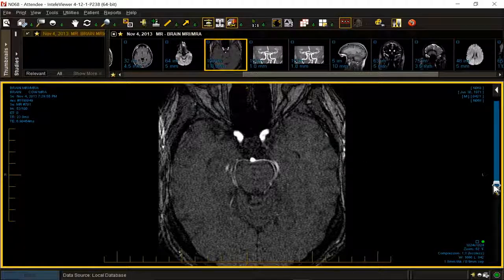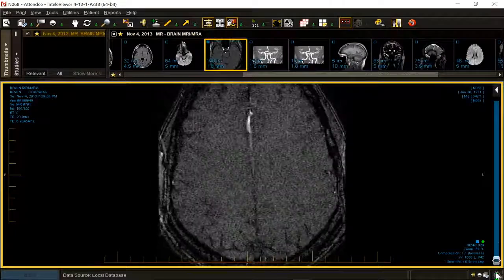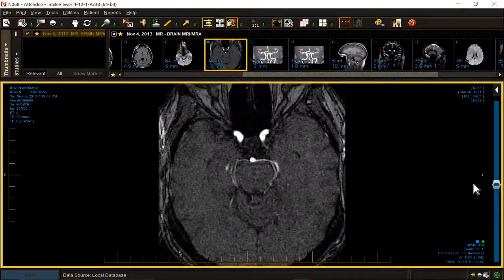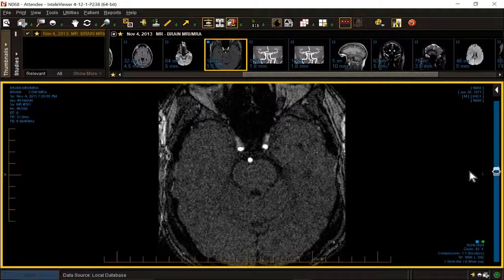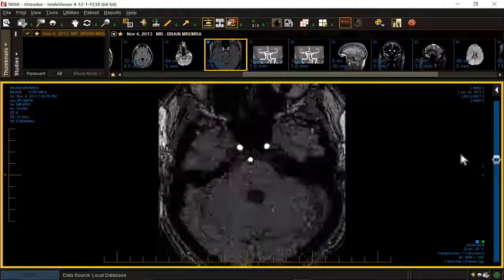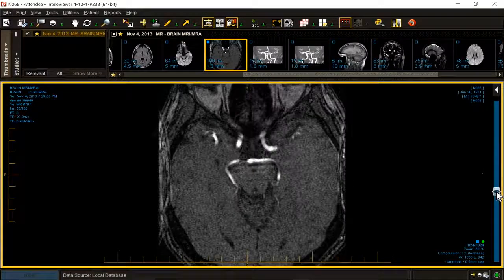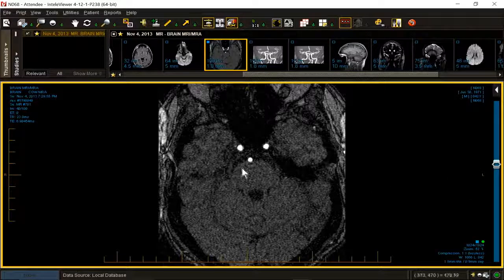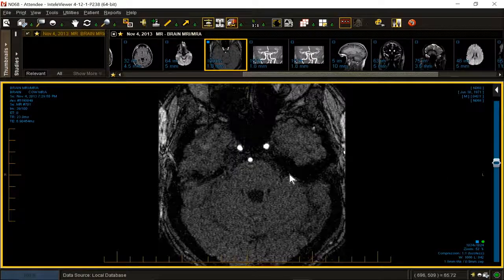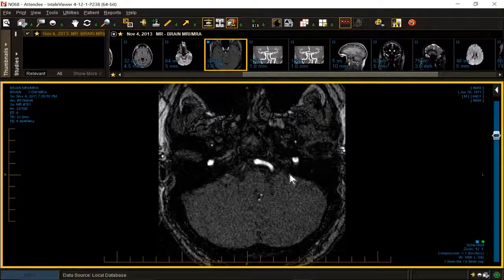So let's have a look. I'd urge you to scroll the raw data. Unfortunately, there's a little bit of movement. Pain is on the right. It'd be lovely to find the fifth nerve. There are the fifth nerves. So far, I am not overly impressed with the fifth nerve.